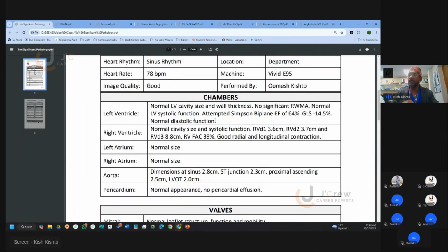Depending on the reporting machine or software you're using, there may be different drop-downs or pre-templates, already organized, where you just double click on it. I don't know which software you use, or whether you free handwrite. This one was our old system where we had to handwrite everything. So what I have in my hand is what I've seen and what I reported.